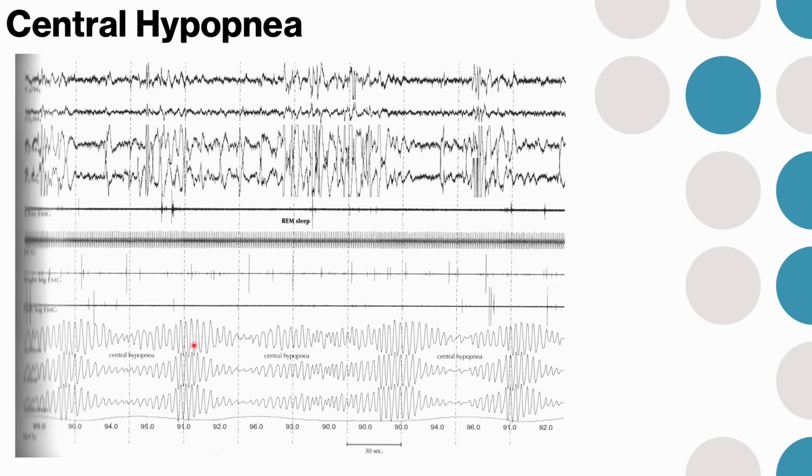It looks like airflow. We don't know where that airflow is coming from. This kind of looks like you've got someone just about fixed on CPAP, but now they're showing complex sleep apnea, where it was obstructive, and now because of treatment they're showing some central activity. And when this happens in REM, remember REM respiration is taken over by a different part of the brain than regular respiration in non-REM. So when that happens in that respiratory part of the brain, that's not great.